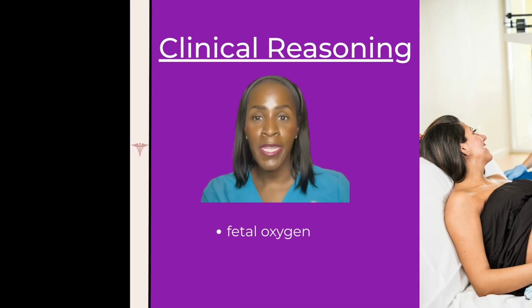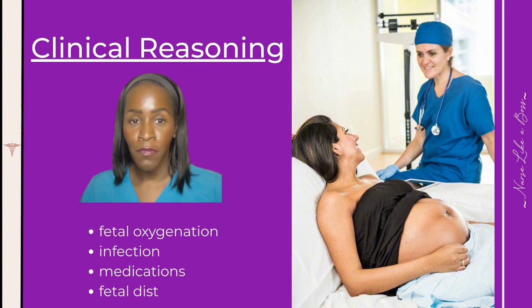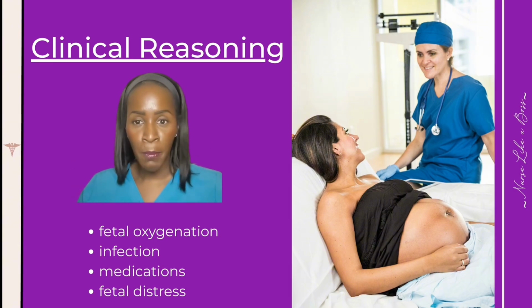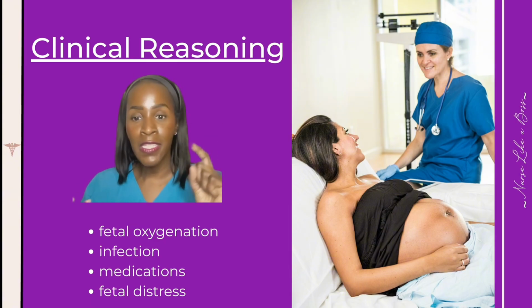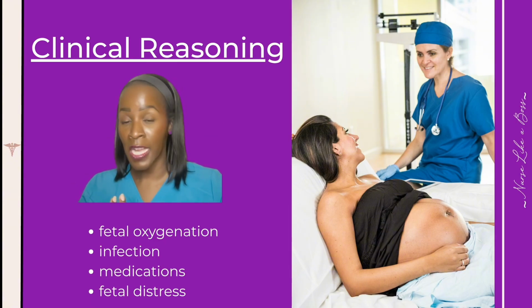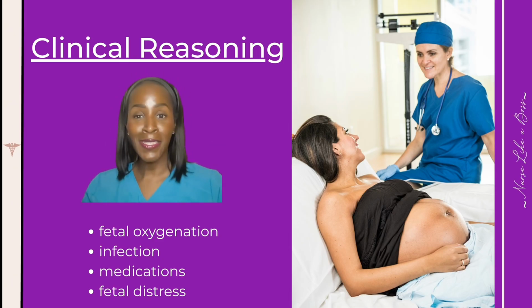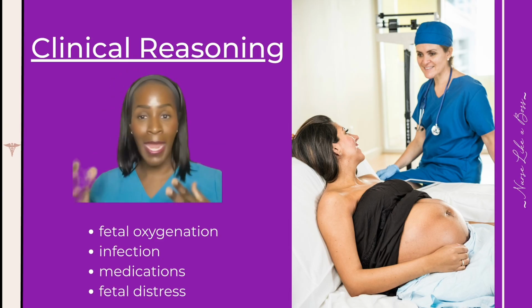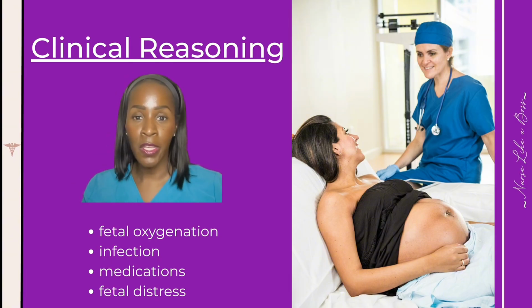So the fetal heart rate is super duper important, right? We are evaluating the baseline first and foremost because it can tell us a lot of things, right? So we aren't just looking for a number. We are looking for a number, and now we are going to take that number and see how we apply it to our clinical picture today. Right. So it can tell us about how well the fetus is oxygenated. It can tell us whether or not mom has infection. It can tell us if there's some medications on board and baby is reacting to that. And it can tell us if the baby is in distress. So that's why we need to get a good fetal heart rate.